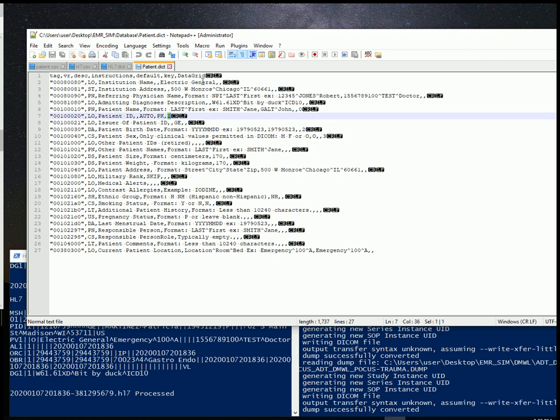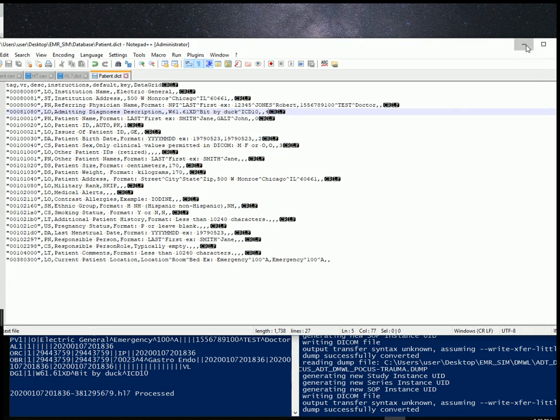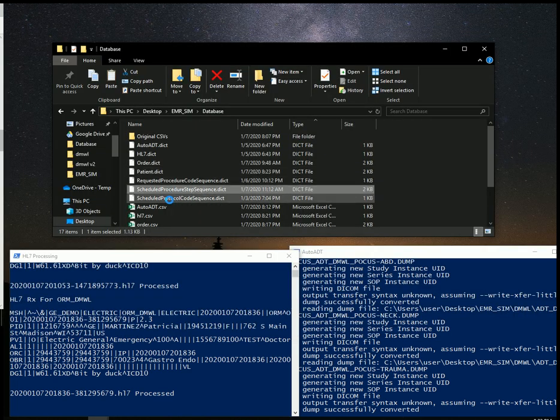The one at the end here, data grid, tells it what I want to display, right? So if you don't like what I'm displaying, you can change these numbers on the end. You can change the order. You could add more, right? So if I wanted to, for patient, let's say I also want to show the admitting diagnosis description, I have 1, 2, 3, so I could make it a 4, right? I'll show you what that looks like. And then you've got these other DICOM fields.